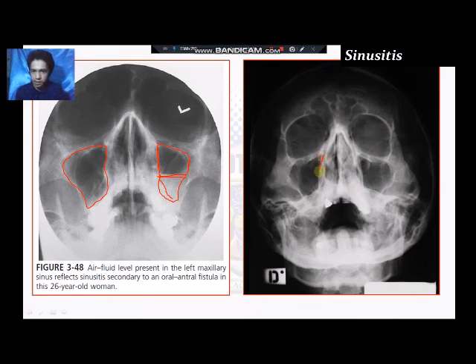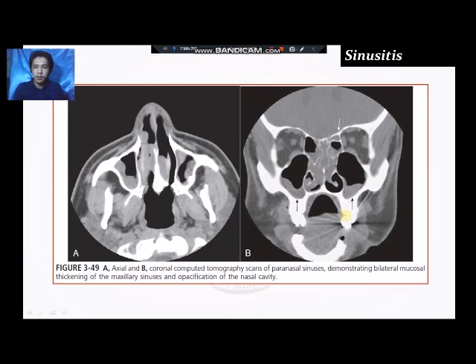Okay, so this is again the maxillary sinus of our patient. So this is the frontal sinus of the patient. Okay, and if ever mag-waters ta, so kanila sila ang makita, no, we have the maxillary sinus and then the frontal sinus, and then if ipahangad pa gyud og ayo si patient, dapat makita pa nato dere ang iyahang sphenoid nga sinus. Okay. So again, CT scan is also helpful in demonstrating if ever na fluid accumulation.